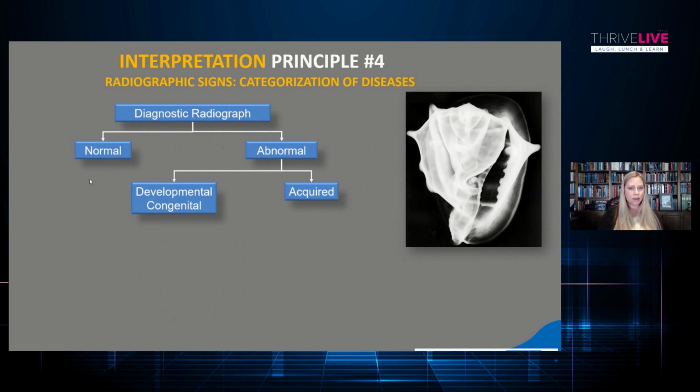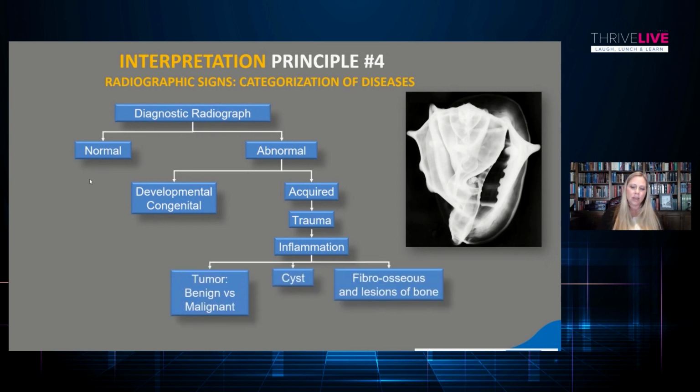And again, thinking commonly, trauma and inflammation. Incredibly common. And as dentists, we are excellent at diagnosing trauma and inflammation. And this is going to comprise about 95% of what we see within our scans. But the other 5% might be a little bit more interesting. If, for instance, the entity looks hydrostatic, looks like a water balloon filling up, we might think about a cyst. What if it's mixed density?